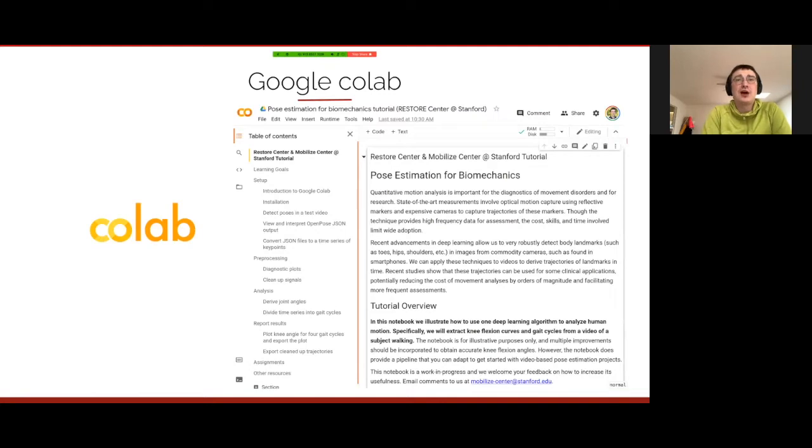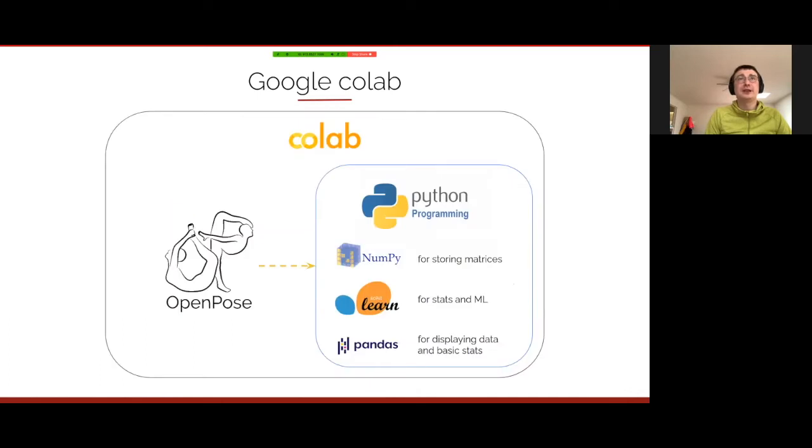So that's how Google Colab looks. As I mentioned, that's an environment from Google that allows you to run any scripts, particularly in Python, and any software other than Python, like any binaries, in the sandbox Google environment, so that you don't have to install anything on your computer. Here's a lot of text because we prepared a lot of explanation, but the main thing will be around running the code. You can think of Google Colab as your computer or any other computer. In particular, here we have a computer in the cloud, which you connect to through a web browser.